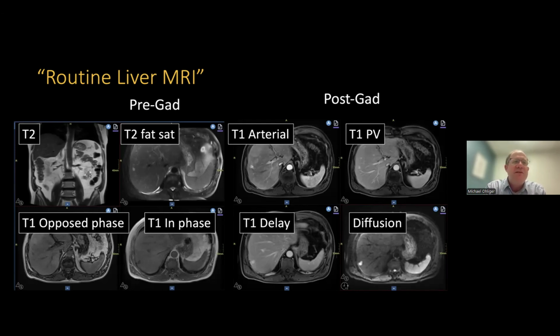Where you have a tough time is if you have an abrupt termination of the pancreatic duct and you're like, oh, someone has cancer. Whether you see something on the MRI or not, you still worry that someone has cancer, and that usually requires an endoscopic ultrasound. And so I hope that helps. And for the next version, I'll make sure I emphasize the P part of the MRCP as well.